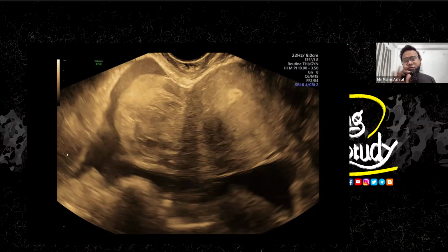And if you talk about fibrosis, that is quite opposite. When you are healing an area, it will be edematous, so it will get darker. So it will be hypoechoic, then you will get isoechoic, then you will get the fibrosis over there, and it will be hyperechoic. So at the end, a scar will end up as hyperechoic, except for the keloid. If there is a hypertrophic scar, it will be hypoechoic.